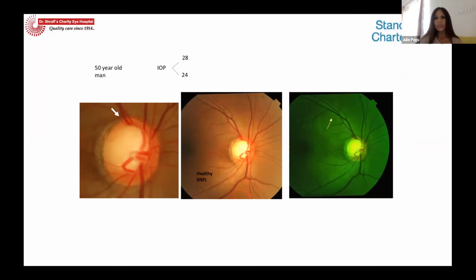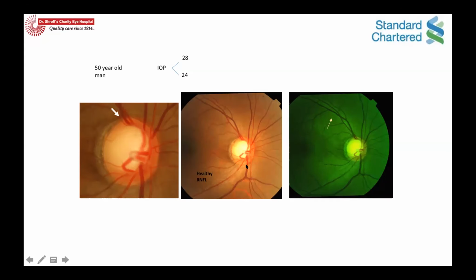Similarly, to detect an RNFL loss, you have to concentrate wherever you feel that the neuroretinal rim is going thin. Like in this patient, it's a large optic disc. You can see some beta changes, and the pressures were definitely a little high for this patient. And when you see the neuroretinal rim here and you see the RNFL, you can see that inferiorly it is.